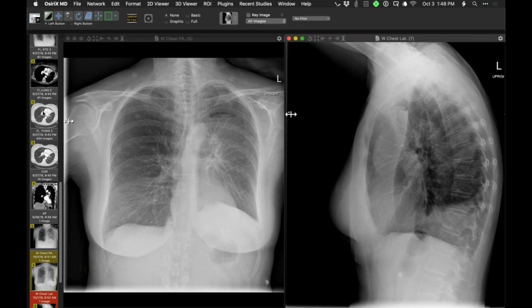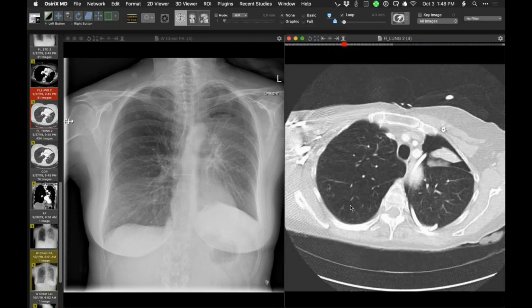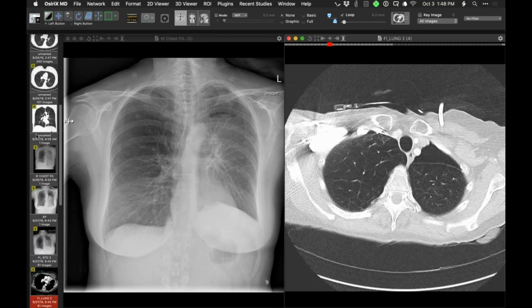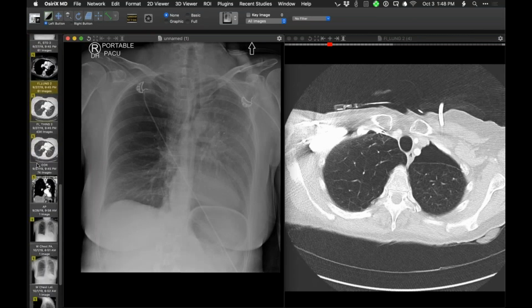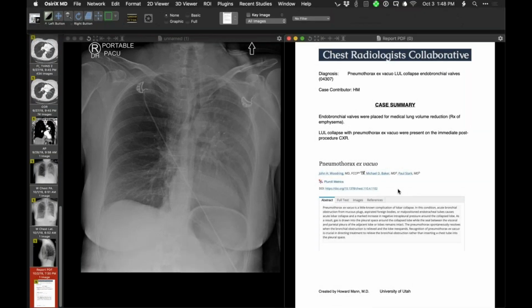Okay, well, it would be nice if they would sample the gas and show that it's pure nitrogen rather than 80% nitrogen. A lot of cases have been presented around here as examples. This is the most clear-cut example, I think, of that possibility, ex vacuo. So I think it is, yeah.